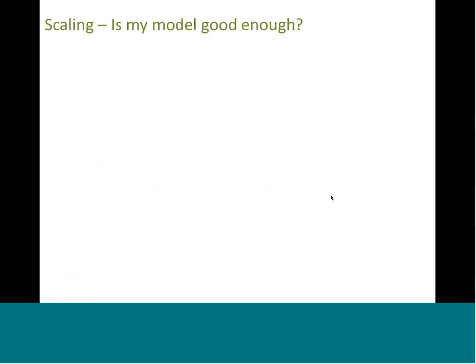Now that you've generated your virtual markers, created your scale factors, and scaled the different bodies in your model, your instinct may be to ask, is my model scaling good enough? Unfortunately, there's still more work to be done before we can answer that question, but we are getting there eventually.